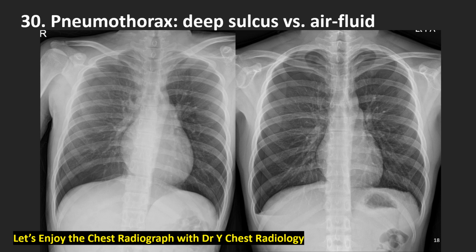We know that when we are in supine position, the lower lobe anterior side is usually higher than the upper lobe side. This lower lobe anterior portion is higher than the upper lobe in gravity perspective. So in AP position, we usually see the pneumothorax here in the down lower lobe, below the lower lobe. We call this sign the deep sulcus sign. It is easier to find the pneumothorax here than the apex.